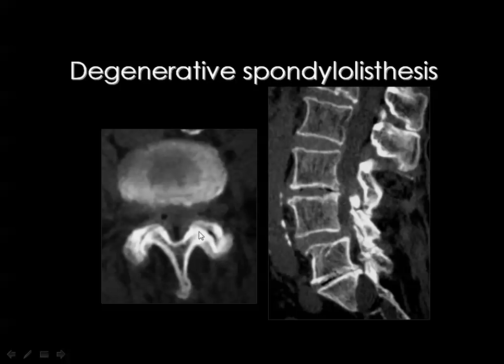If the facet joints are the seat of osteoarthritis, then this is the cause, and this is first degree degenerative spondylolisthesis. But if the vertebra has moved anteriorly relative to the vertebra below, and you look at the facet joints and they are okay, you are sure now that the pars is broken. This rule applies only for first degree spondylolisthesis.